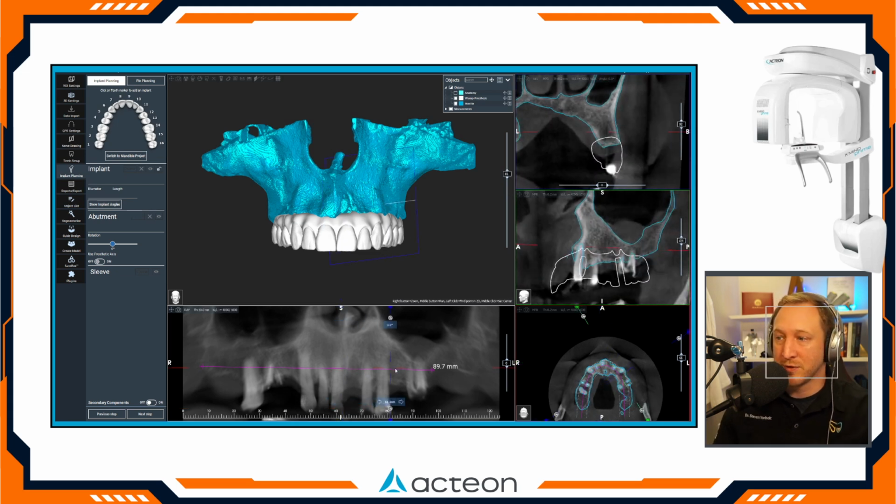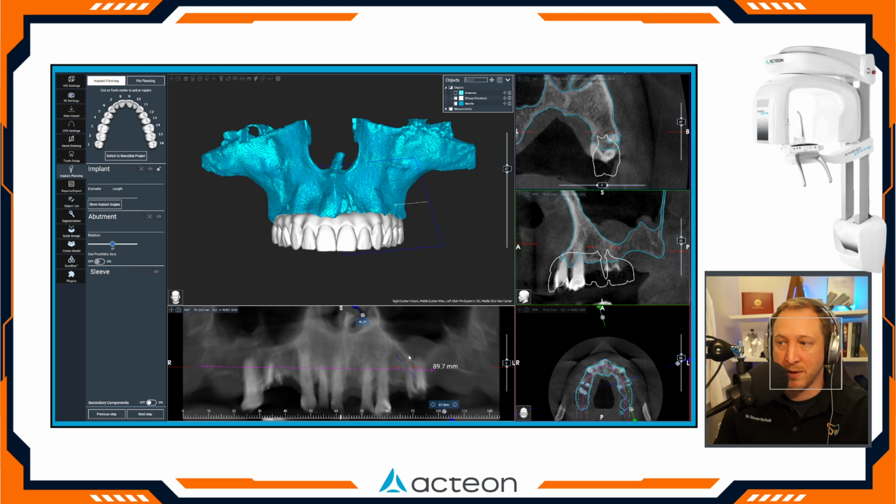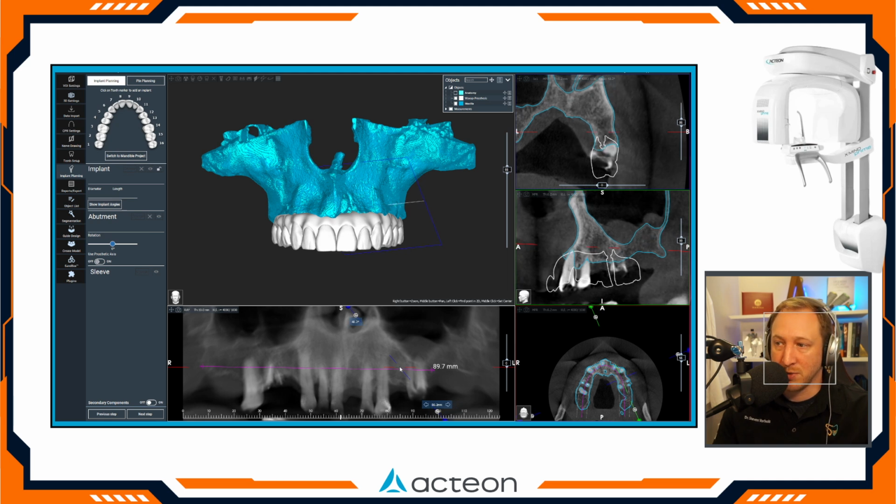Okay, so first things first, let's do the posterior implants. I go back to underneath the sinus. I angle to be parallel to the sinus wall. Now, you could aim for 30 degrees here because you're going to use a 30-degree multi-unit, but we have options for 45-degree multi-units, as Dr. Miller discussed. And we can also be 20 to 30 degrees divergent from our multi-units too.